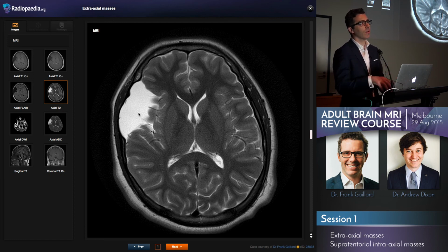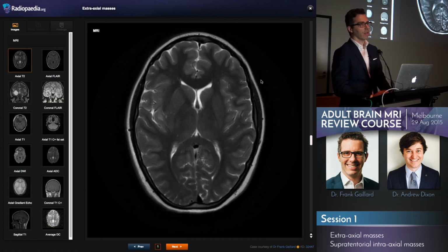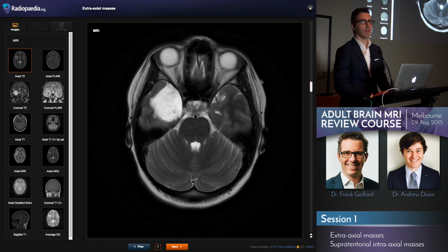This is particularly helpful in the spine, posterior to the thoracic cord, where you get a spinal arachnoid cyst. There's usually a lot of pulsation artifact, and seeing a lack of that extending through is a very helpful sign. But it can also be useful in the intracranial compartment. It'll follow CSF on absolutely every sequence, and that's critical, including diffusion weighted. There's not much that can mimic that other than an epidermoid cyst, which can sometimes look similar.